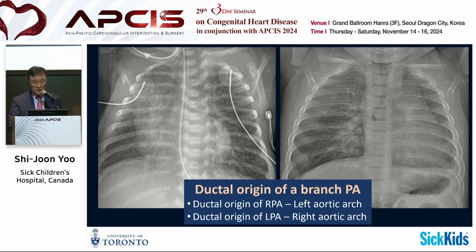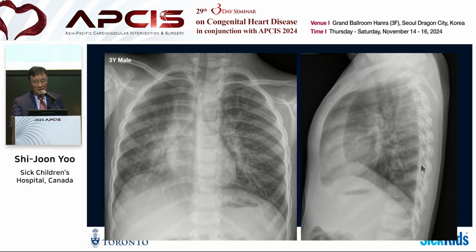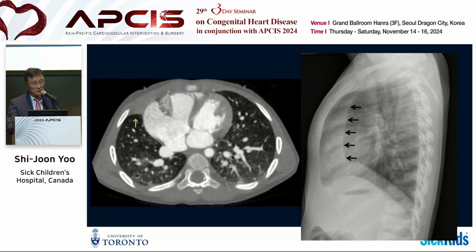Okay? Therefore, in this case, right aortic arch with the small left lung is the telltale sign to the right diagnosis. Do you see anything here? So again, you have your right lung hypoplasia, and then in the lateral view, you have a very hazy thing behind the sternum. Okay? So that is called the retrosternal hazy band. This is a typical finding of scimitar syndrome.